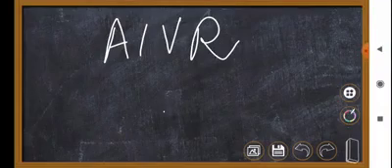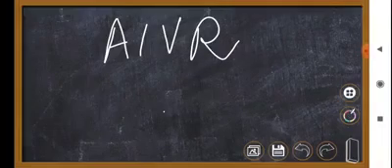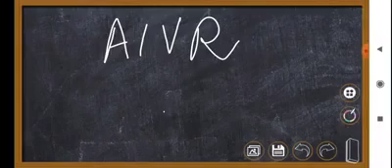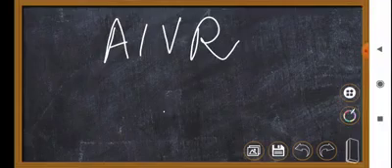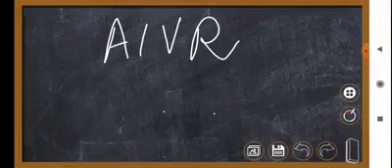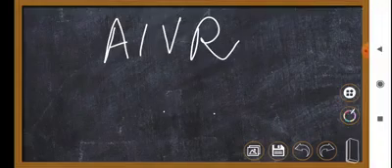In case the rate is less than 50 beats per minute, it's called a ventricular escape rhythm. And if the ventricular origin beats are there and the rate is more than 110 beats per minute, it is called ventricular tachycardia. But a rate between these two extremes, that is from 50 to 110 beats per minute, is called accelerated idioventricular rhythm. So this is one feature.